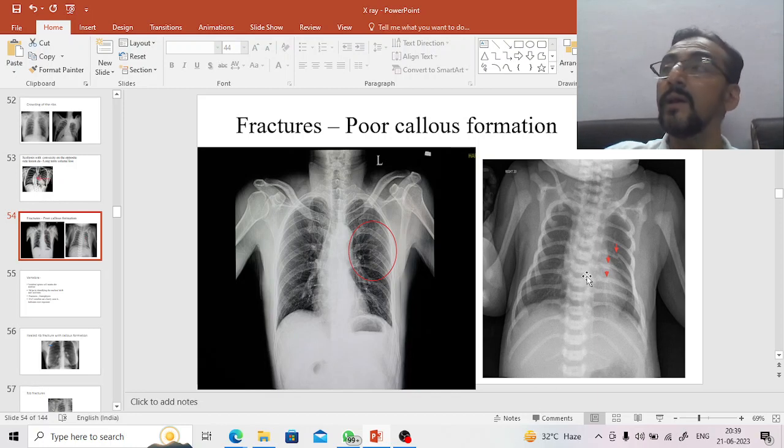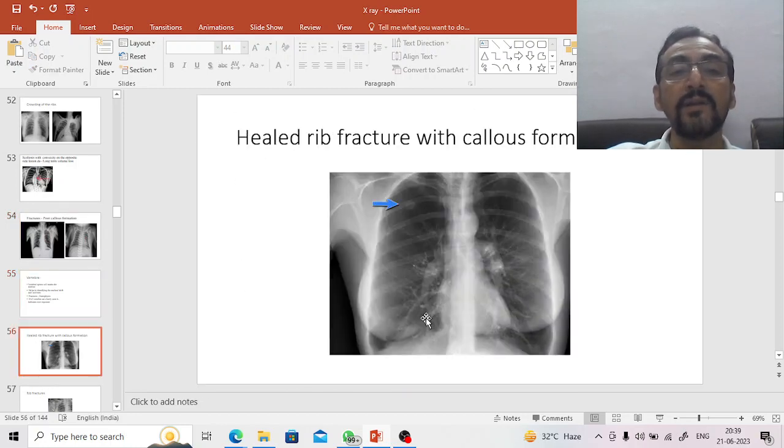Usually, in the X-ray we normally take, after T8 the vertebrae are not seen so well. But if all the vertebrae are seen very clearly, then usually we will call it overexposure. There is no harm as such, but it may create a lot of confusion in reading. Anyway, that's one important thing.